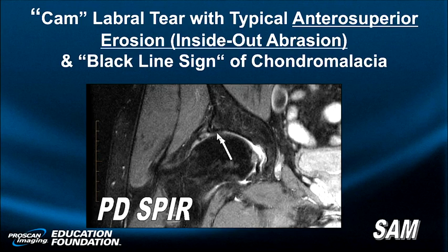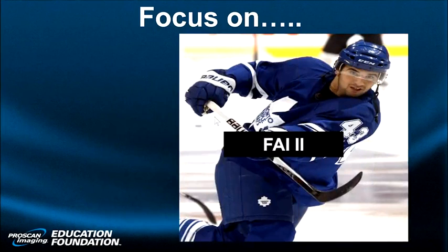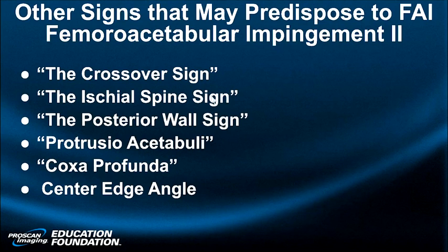glycosaminoglycan milieu. It's desiccating. So that is what an abrasion looks like, the so-called inside-out abrasion associated with this complex labral tear, and he's starting to strip the iliofemoral ligament from the lateral acetabulum. I think you'll get a more full understanding once you see the video, which I hope to show you.